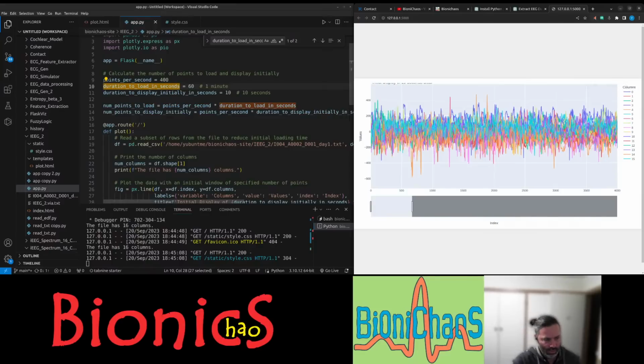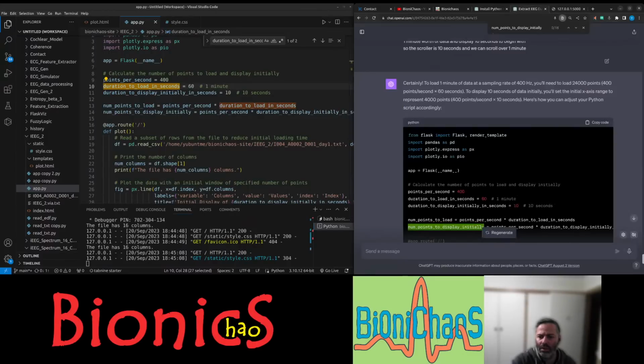I think it's this hidden. Can we correct a few things? First of all, the label above the chart is not displaying properly. It's half hidden.